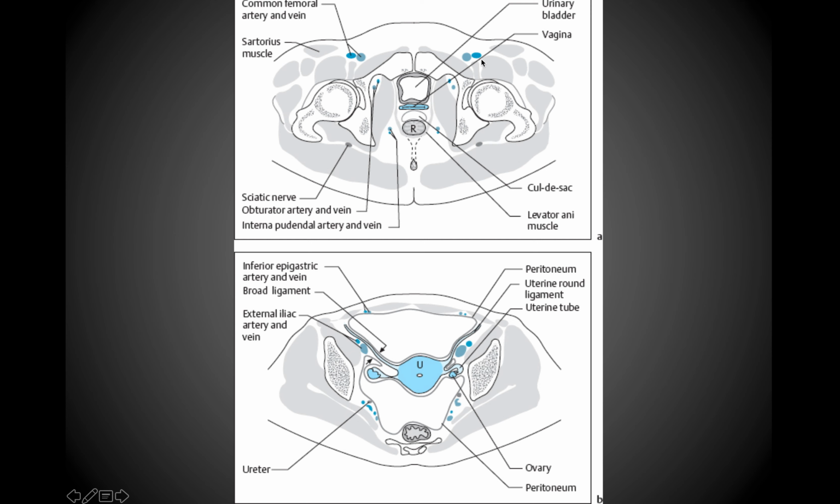So first off, up in the upper right-hand corner, we can see the femoral artery and vein. Remember that like we talked about before, the vein should be somewhat darker and larger than the femoral artery. Then we can see the pubis and then the ischium with the acetabulum back here, and you can see the femoral head sitting within that acetabulum. You can also see the obturator internus muscle right here coming around.